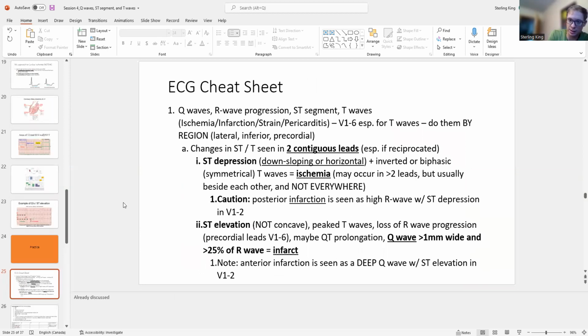I think one of the ways we could also describe how you're interpreting the T waves is, imagine you're getting your history from the ECG. You're getting all your history: what's the rate, rhythm, axis, intervals? What's the hypertrophy looking like? Are there Q waves? Then you're using the T waves to back up what you already know. If it goes along with it, it helps. If you didn't see it at all, it wasn't needed either, because you already interpreted what you had from your history.